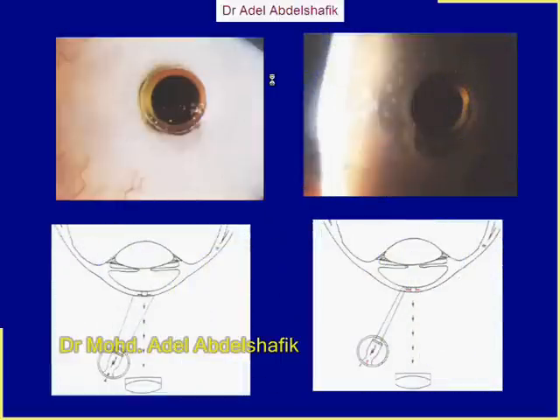I want you to see these two images. Here we see only, this looks like an iris and pupil, and we don't see anything here. But here you can see there is some ring here with dots in. This is a keratoprosthesis implanted in the cornea, this totally opaque cornea. In this image, you just see the cone, the prism part. But in this part, you can see this part of the keratoprosthesis embedded in the cornea.